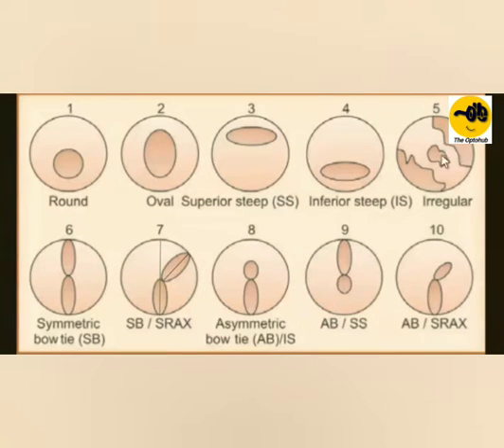Next is an irregular pattern. This kind of pattern you might see in cases with very low astigmatism, or in cases whose tear film is not steady, or in cases in which the patient has undergone some sort of keratoplasty, or there is a trauma and so on. So this is not classified anywhere. Whenever you see such patterns, it's an irregular pattern. But you have to remember one thing, that whatever pattern you observe, you have to correlate it clinically.